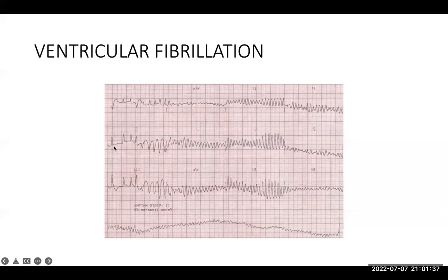But look at this. It's very irregular. It's chaotic. There are different types of graphs. One is tall, one is short. The distance between these two is not the same as the distance between the other. So when you see this kind of rhythm, this is a very, very dangerous rhythm. This is a patient you defibrillate, you shock.